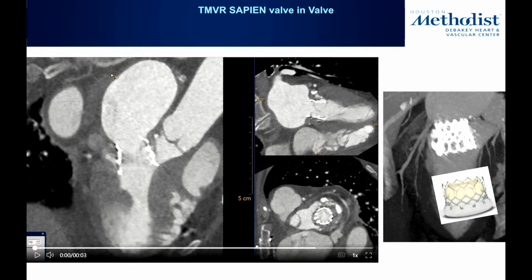It's not a covered stent. Depending on design, you need to know. That's why you need to keep updated with this type of valve design to know where the opening is, where the skirt is. But Carlo is absolutely right. The anterior mitral leaflet is mostly the responsible one.